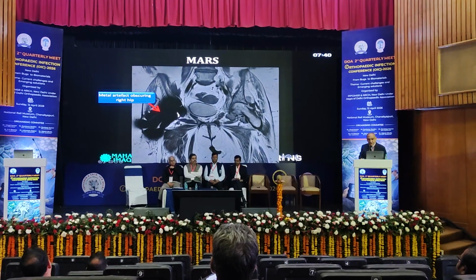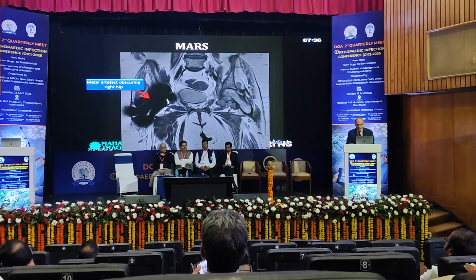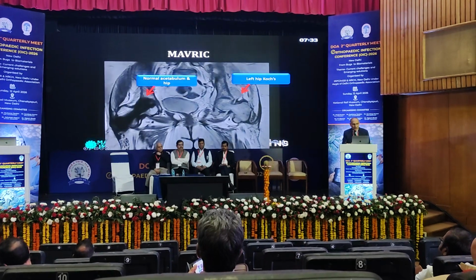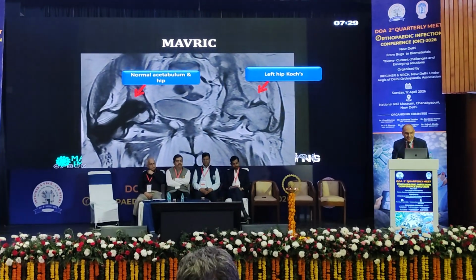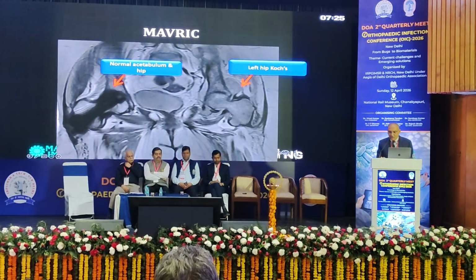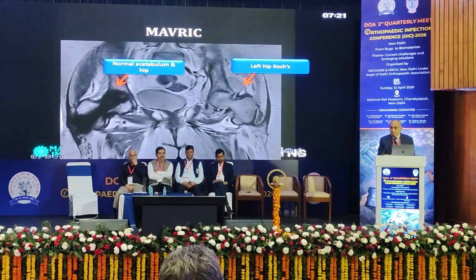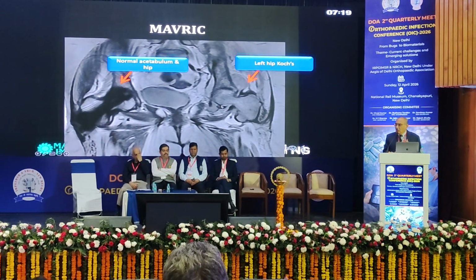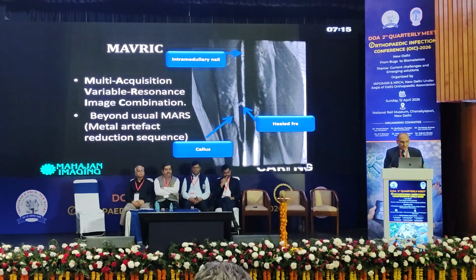Question of any visible anatomy underlying the implant. And if we look at MAVRIC, it starts showing everything very clearly. Of course, in this case, there's a problem on the opposite side, which was a tubercular hip. So MAVRIC is the way to go when we are going to be looking at post-operative.